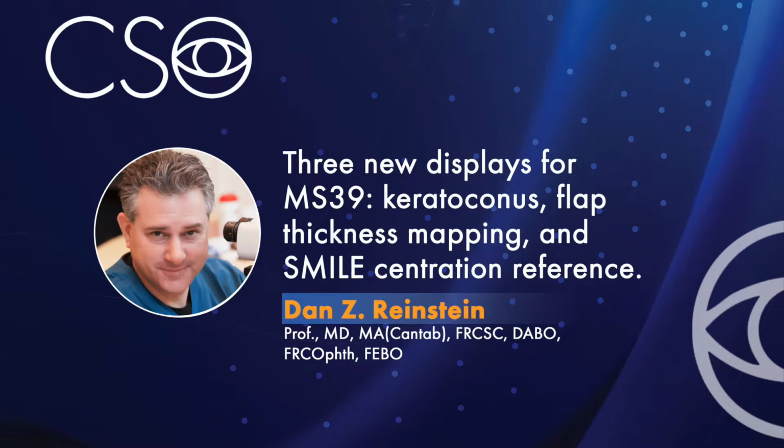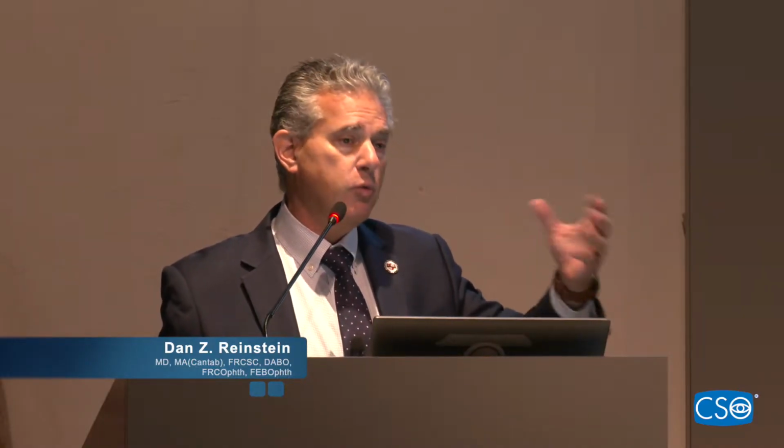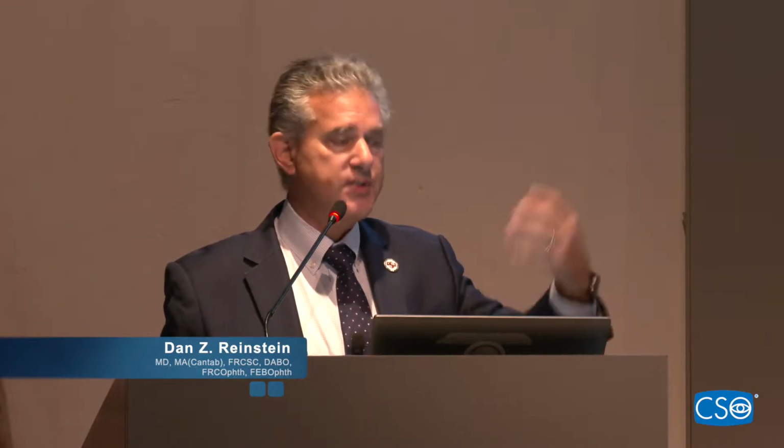Like I said, what I'm going to do is use the software in front of you, the way I set it up and the way I use it. Now, the settings that we have here are settings that we chose as a preference in our clinic. And we have suggested to Francesco that it may be possible, if you want, to ask for these settings in your clinic. Currently, when you receive an MS39, it doesn't have these settings.